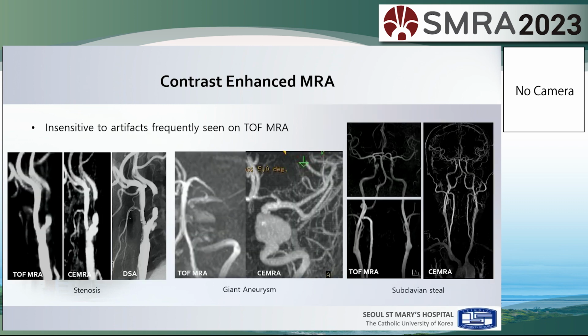As I have told, saturation artifact at severe stenosis is less frequent with contrast-enhanced MRA, and the saturation artifact from the giant aneurysm is erased by contrast-enhanced MRA.